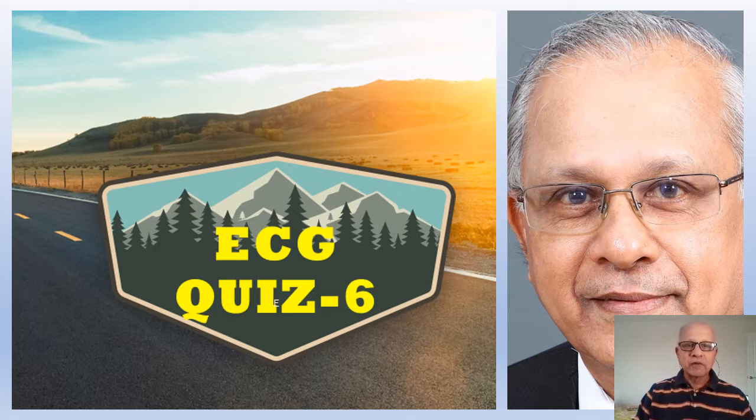I hope you are also revising the previous sessions of ECG classes which I have taken you, and this will help you solve these ECGs correctly and quickly. We will go on to the first ECG.